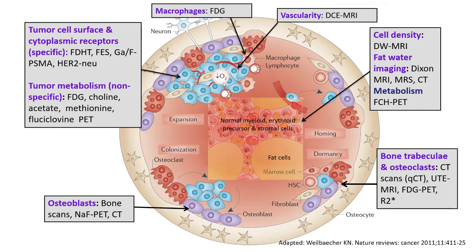Then you have to ask yourself the question, why are brown tumors hot in PET scans? Because they're osteoclastic tumors, correct? Why are they hot? Well, they're hot because macrophages and osteoclasts are also visualized by FDG PET. So I've got an osteoclast here, I put FDG PET there. So remember that when we look at technologies and we assume things about what compartment it is that we're looking at, it may not necessarily be true.